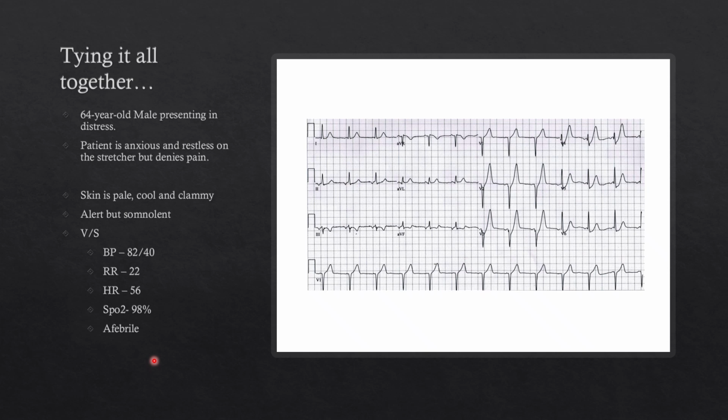If we let this sit, you're going to end up seeing those ST segments go from depressed to elevated and a more classic anterior pattern. So this is a patient we caught early, and if we can get them to PCI, they have a good chance, or a better chance than they would have if we waited, to have a good outcome.